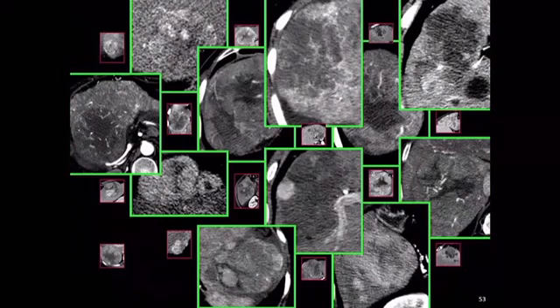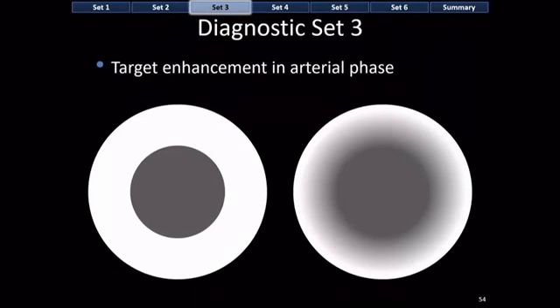So if you can tell me with 100% certainty, then you are clearly a very, very good radiologist, because I certainly can't tell you. So I have to cheat. And there it is. The strawberry ones were the metastases and the green ones were the HCCs. Okay, but anyway, mosaic masses are malignant. That's the key point.